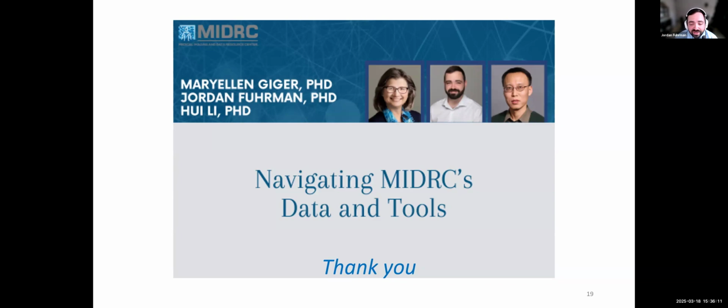So that's all you really need for at least those two tools, and then the other two web-based tools. I've clicked through them on my own just to learn a little bit. I haven't used them yet for my research, but they're web tools that you can click through. They're extremely easy to use. Yeah, I just want to add, for the downloadable tool, if you look at the instructions, we also have the example data set. So you can just follow the example data set to format your data, which is easy.